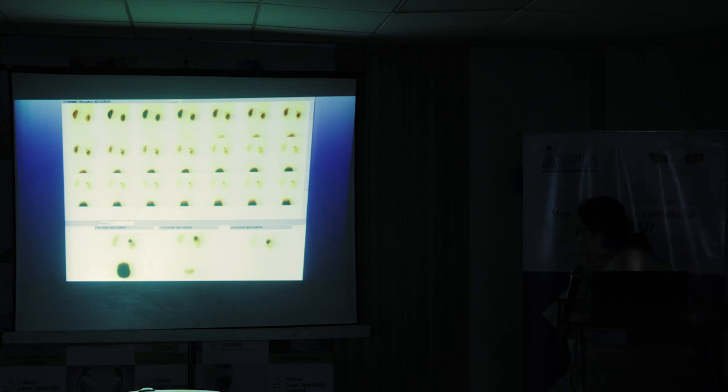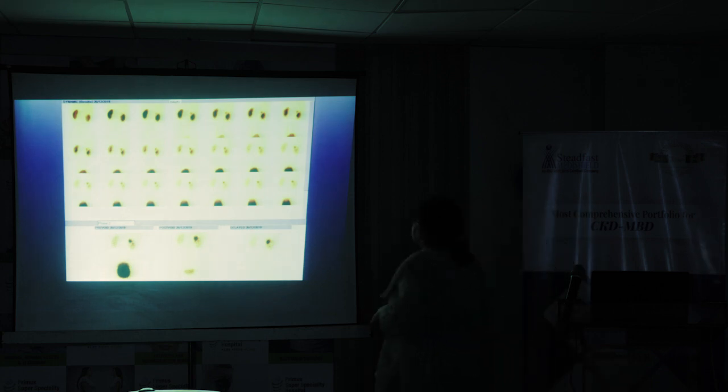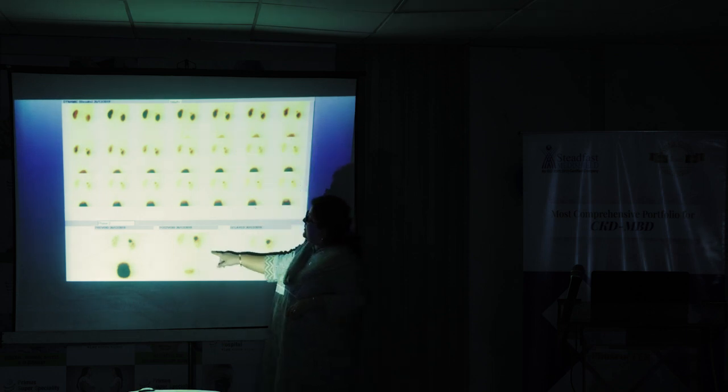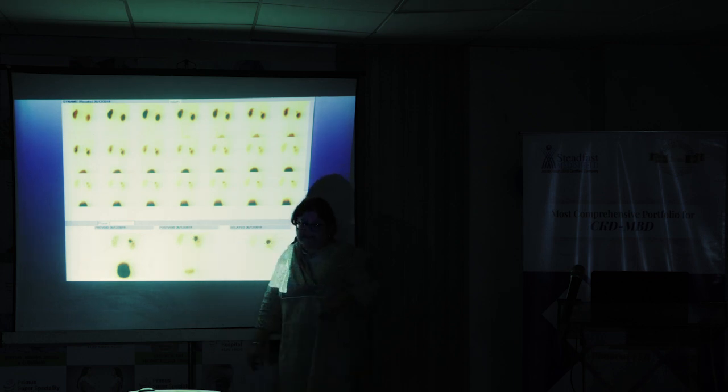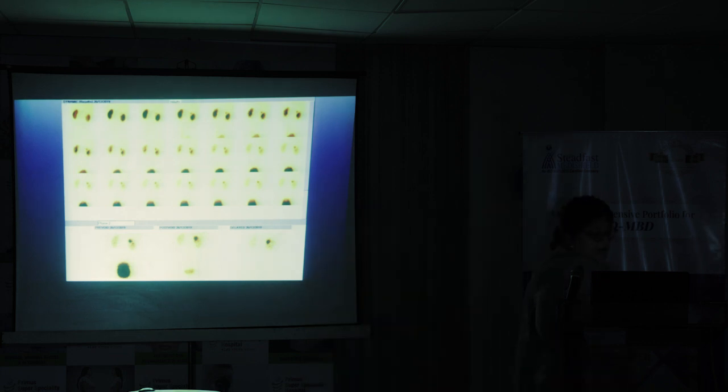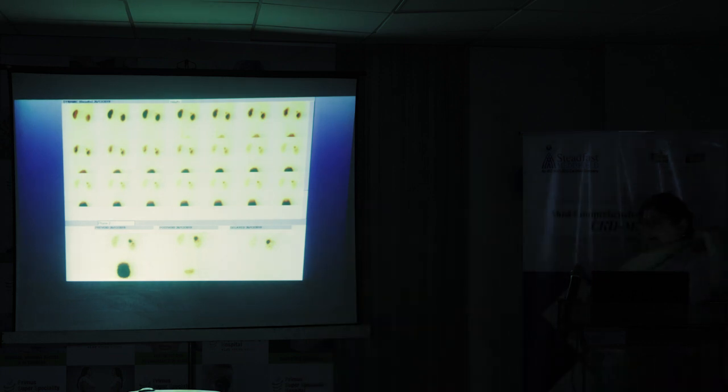No guesses? So you have this kidney which has got two parts. The lower part is showing a good uptake and a good excretion, whereas you're seeing some tracer hold up in the upper part. So what is this? This is a duplex kidney.